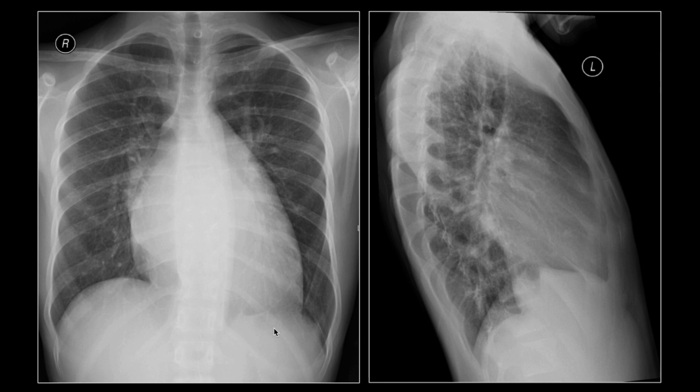Going to the basics, we know that the left cardiac border is formed by the left ventricle. We know that the right cardiac border is formed by the right atrium. While the left atrium lives posteriorly and does not contribute to the borders of the heart except for one location, which is around here, immediately below the left main bronchus and hilum, where you'd expect this area to be composed of the left atrial appendage.